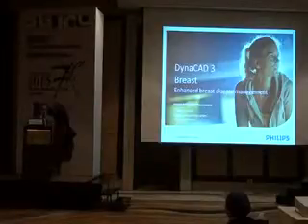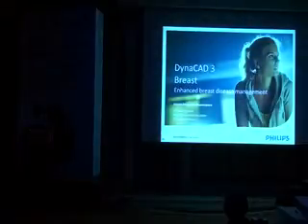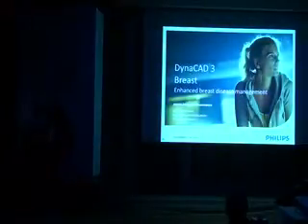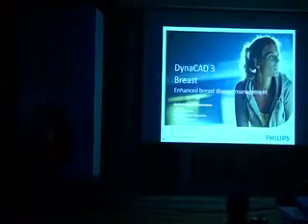Good afternoon. I would like, in this short presentation, to show you the new tools for enhancement of MRI breast post-processing and analysis. Since MRI is considered one of the important tools for breast diagnosis, there is a new tool which is called DynaCAD.